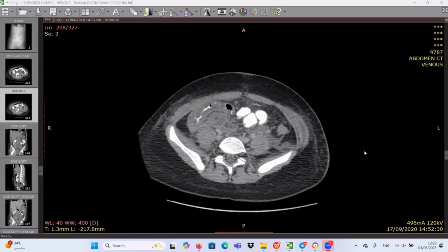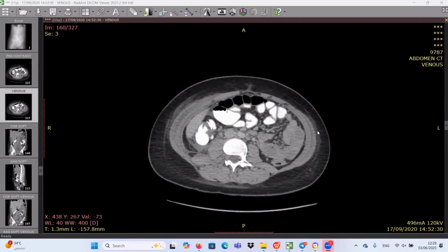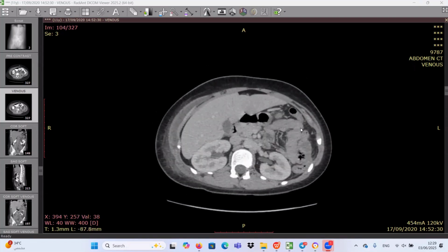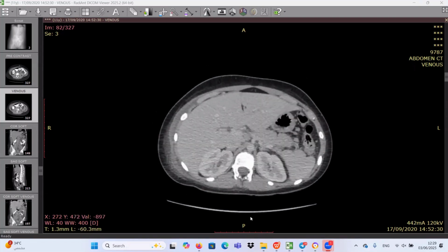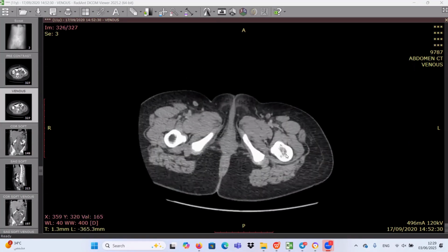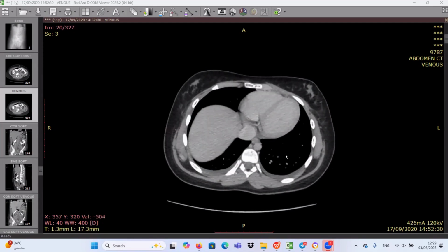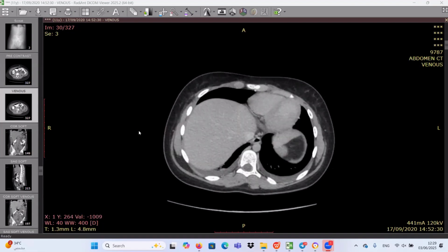Okay, sir. I'm provided with a CT scan, axial section. This one is the post-operative status. Can you help me? Which operation? Can you give me details for this operation if you try to help me? Okay, sir. I'll scroll and I'll try to figure out.